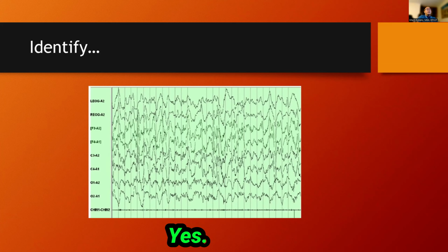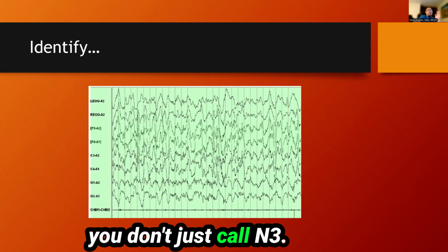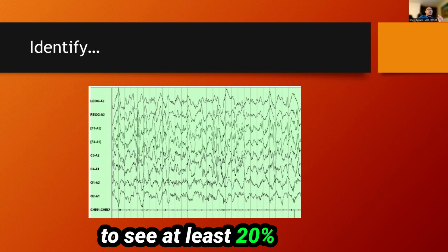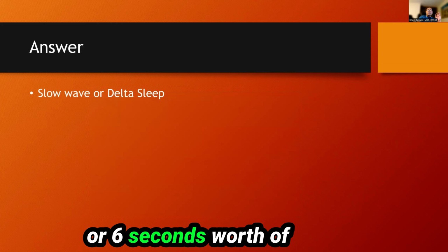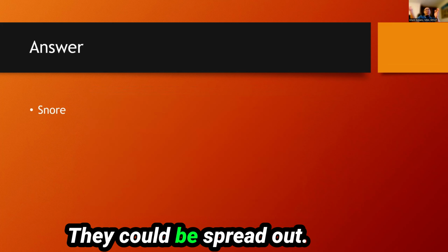Correct. It's still N3. So when you take the exam, make sure that you don't just call N3 when you see so many delta. You really just need to see at least 20% or 6 seconds worth of delta activity, because they don't have to be clumped in one area.